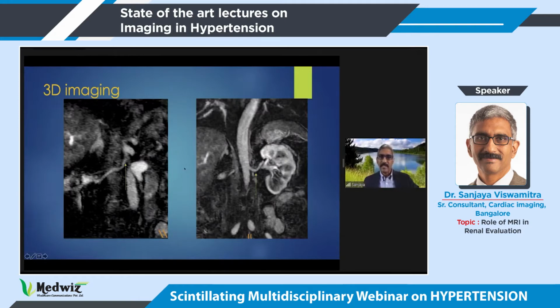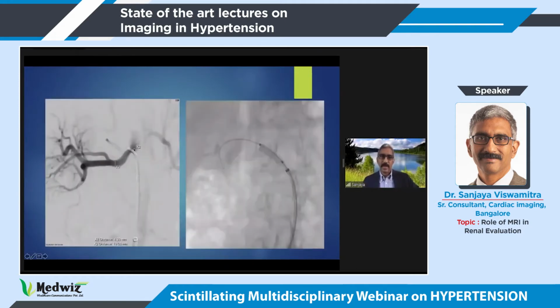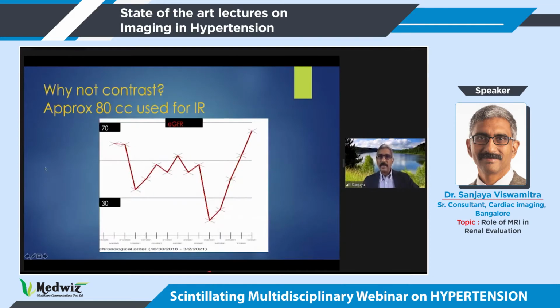This patient then went in for an angiogram where they basically noted that we had some very focal narrowing at the area of stenosis, a relatively longer segment which was perhaps 50 to 70%, and the area of significant stenosis was at least 70% plus. Patient then went in for a stenting through that particular region. So the first question that I hope I've shown you is that MR angiogram can evaluate the presence of renal artery stenosis.